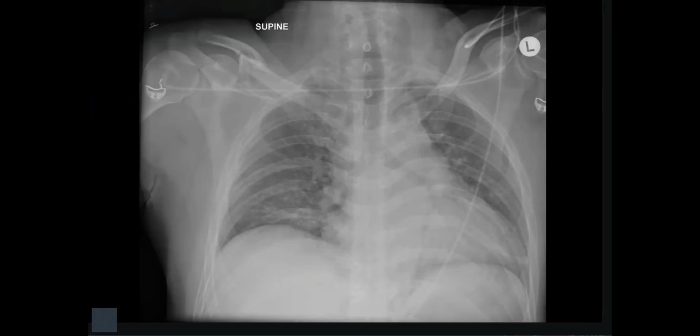I have been provided with the frontal radiograph of the chest where I'm seeing a displaced fracture involving the lateral end of the right clavicle. Otherwise, the right acromioclavicular and right glenohumeral joints appear congruent. There is no pneumothorax or hemothorax. There is no obvious displaced rib fracture on the right side or on the left side also. So no rib fractures.